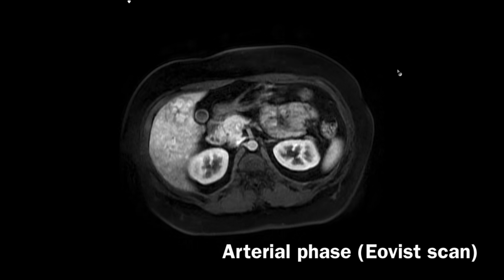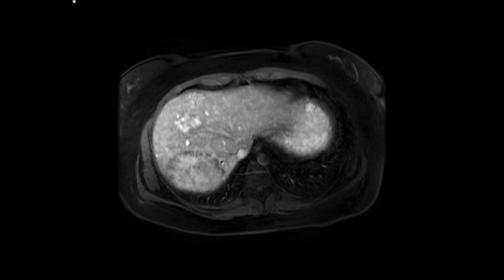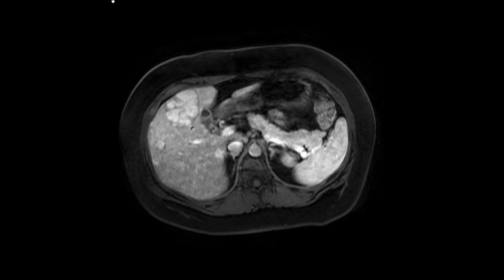And this is an arterial phase image. So the artery is quite well opacified, the portal vein is opacified, and the hepatic veins are just starting to opacify, so this is a little bit late. But you can see that this lesion down here demonstrates arterial enhancement around a non-enhancing central scar.